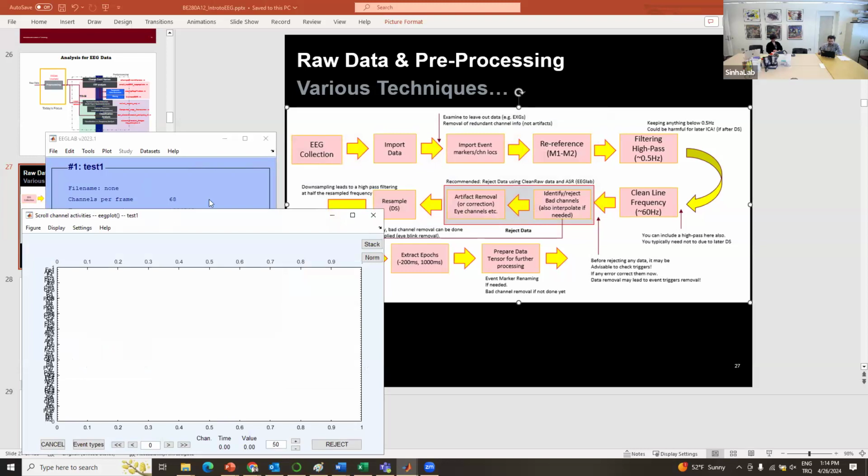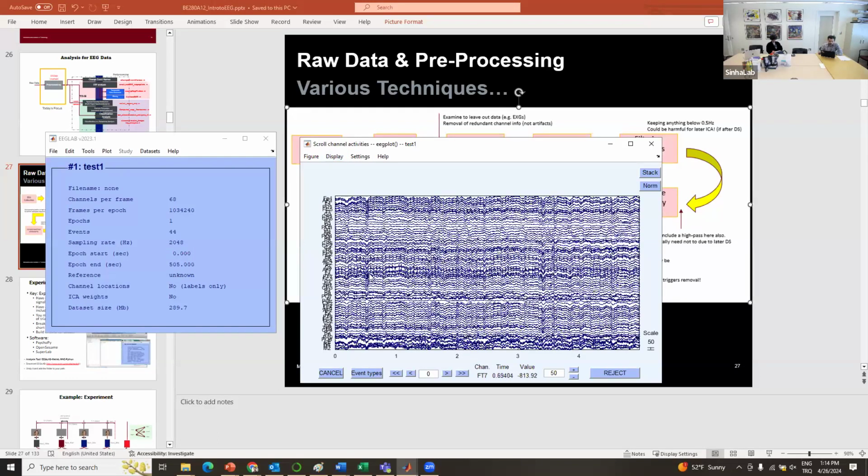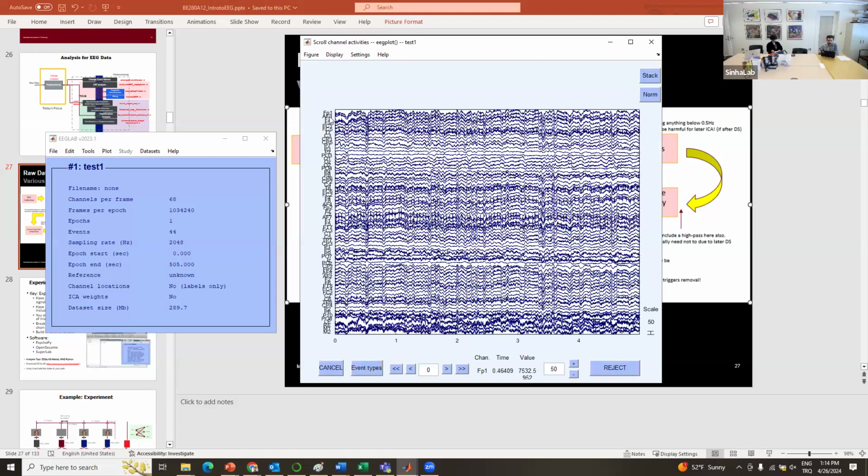Okay, and then you have your signal now displayed, and if you remove the DC component, you will realize that there are no more extraneous 4 channels at the end of this channel list, right? And one thing you might already realize is that these channels are already named, right? You see FP1, AF3, and etc. In many cases, they're not named automatically, so you may need to name them using channel location information.